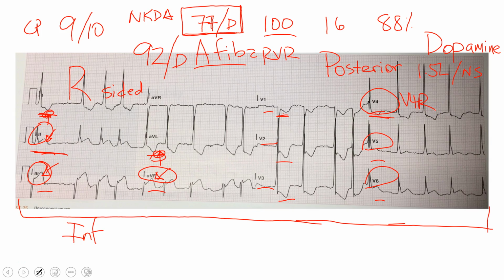And that was our case. So once again, we're looking at our 12 lead. We saw depression here. We saw elevation, elevation, elevation. What do we see here? Looks like some depression, as well as this depression here, which, like I said, starts making us think about the posterior wall. So that's the case.